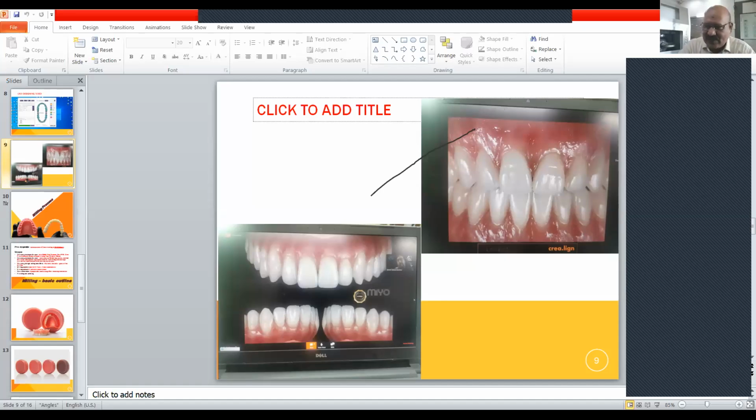So the choice goes for the hybrid denture or a custom abutment, Dr. Divya said. Here I choose this, maybe 5.